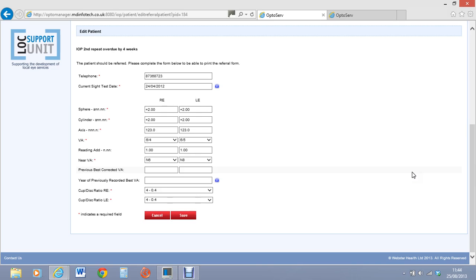Alright, and it just allows us to give you a reminder. We'd phone you up and say, look, you've got this patient on here, you haven't done anything with them. So it's just foolproof. That's another check that will come through to me, who's auditing the system, to make sure that you're keeping up to date with all your patients.